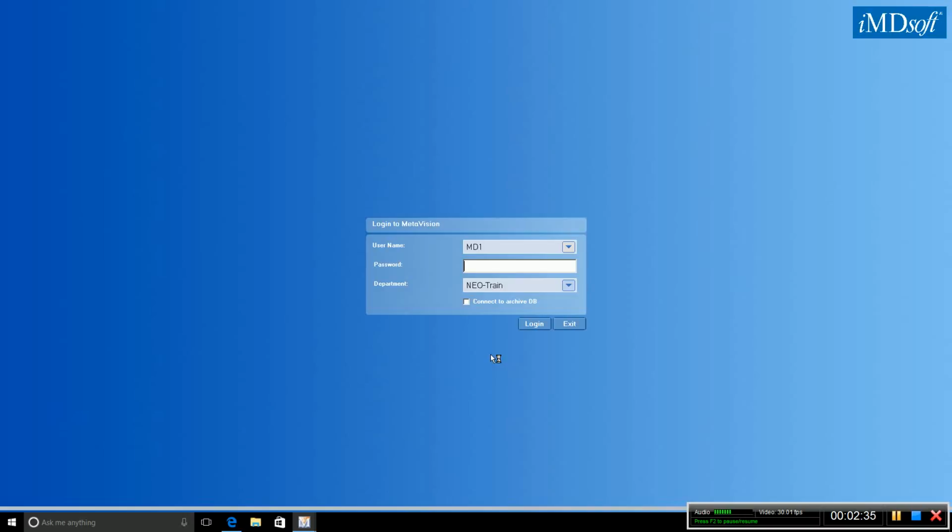Today in this brief training video I'm going to show you how to log into the system and do some basic navigation around to select a patient. Now the login for eCritical is the same as you would use for all of your other AHS logins. So for your AHS mail server, or if you're using the impact system, anything which is part of the AHS network, you use the same login name and password in order to get into the system.